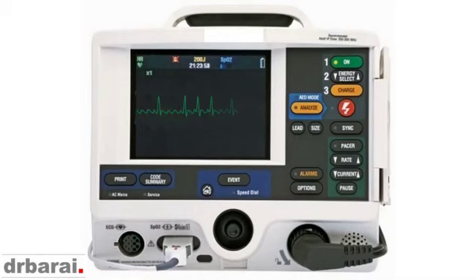Sometimes you might find atrial flutter to be irregular, but the difference between atrial flutter with variable atrioventricular blocks and atrial fibrillation is that you can detect the P waves. In this case, as you can see in the baseline, you can see the P waves, QRS complex, P wave, QRS complex, P wave, QRS complex. So all over the place. Sometimes it is 1:1 block, 2:1 block, 3:1 block, 4:1 block. This is called atrial flutter with variable blocks.